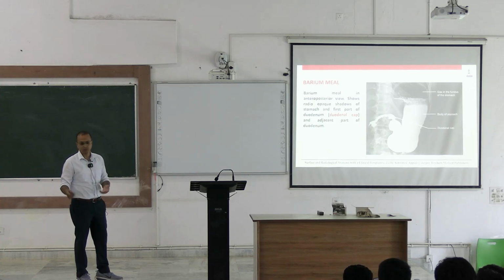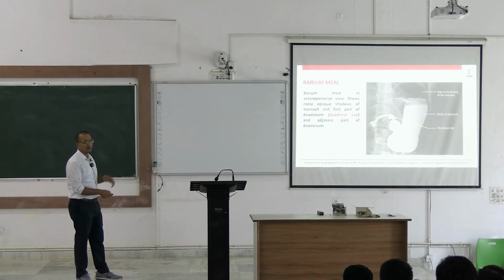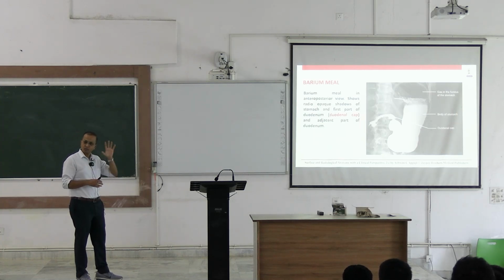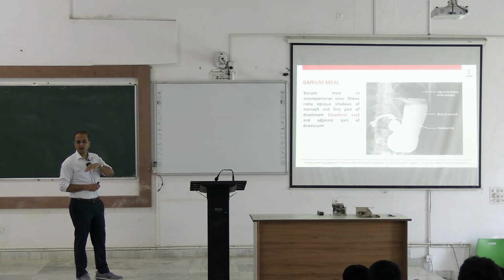Again, this is a special X-ray. Within the special X-ray, can you see other things like bony shadows and soft tissue shadows? Of course. The region and the description remain the same. What kind of X-ray is it? It is a special X-ray. What kind of view is it? Anteroposterior, posterior, anterior. What region are you seeing? The same thing, the abdominal region. What do you see in the abdominal region here? A bony shadow, as well as soft tissue shadow.